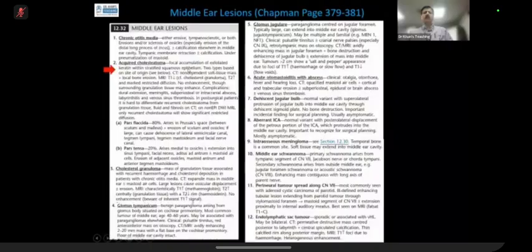This will not enhance either on CT scan or on MR. Surrounding granulation tissue can enhance. Key point to remember is that cholesteatoma will show restricted diffusion on MR. This is a key point to remember. Actually, you remember in CNS, we have done epidermoids. Now, histologically speaking, epidermoid is the same thing as cholesteatoma.